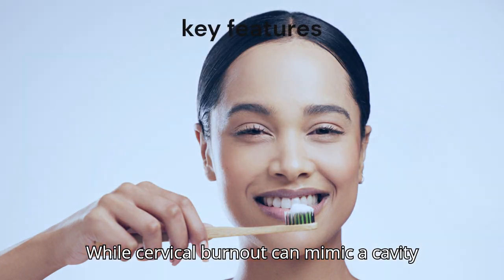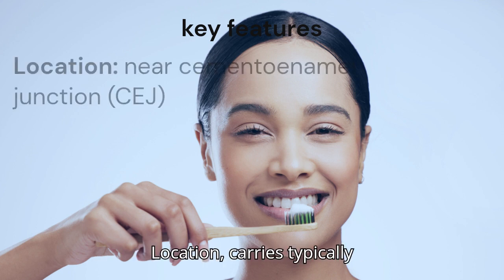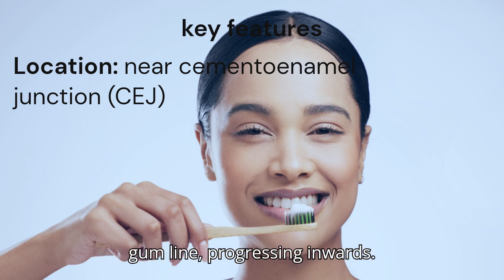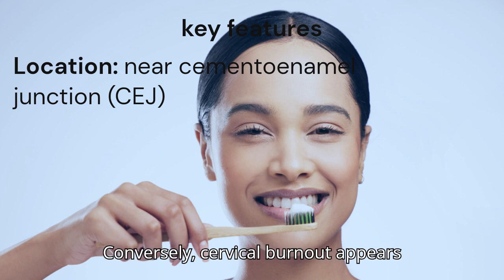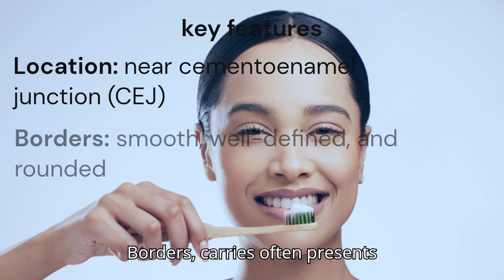While cervical burnout can mimic a cavity on X-rays, several key features help distinguish them. Location. Caries typically initiates on the tooth surface above the gum line, progressing inwards. Conversely, cervical burnout appears strictly at the cervical region, adjacent to the alveolar bone. Borders.